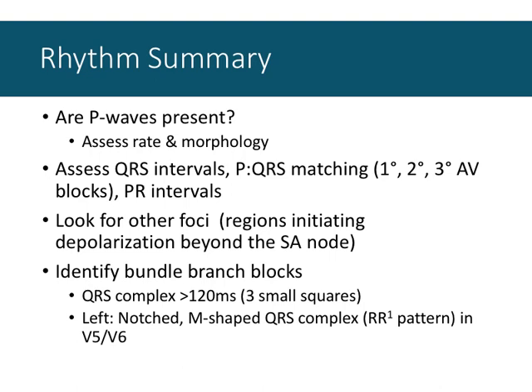And this last point does kind of get into a bit too much detail. You can get into detail for any of the above blockages as well, but we just talked about the left bundle branch block being characterized by, I didn't tell you that it was the RR1 pattern, but just the bimodal R wave where we have two QRS complexes that are overlapping in succession, at least from the view in the V5, V6 axes. V1 and V2 much different, and we saw that on the examples already.